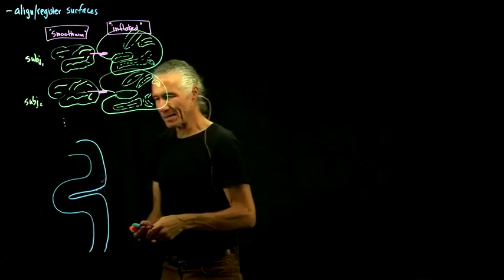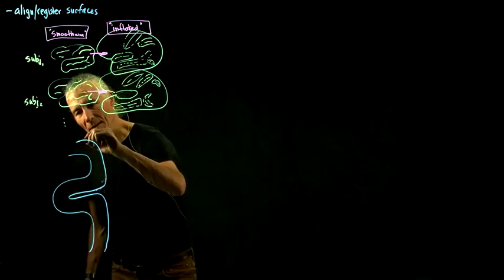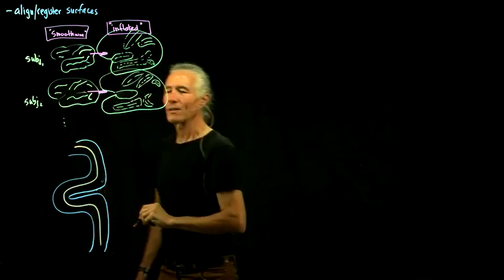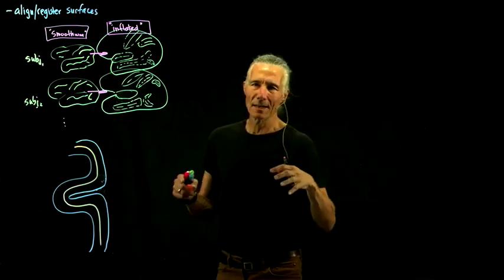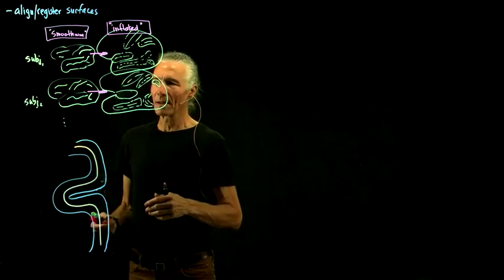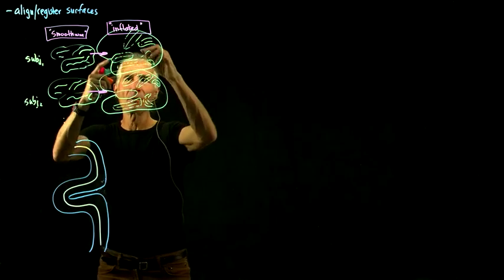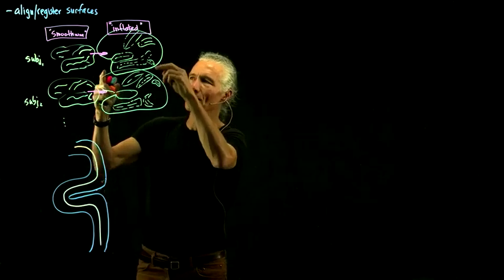So if we have our surface here, say we put a surface in the middle of the gray matter. Okay, so here's our surface, and we just inflate that, meaning expand it without stretching it, and then just measure how far each vertex moved. What do you get? Well, this is about the right scale of what the brain looks like when you inflate it without stretching.